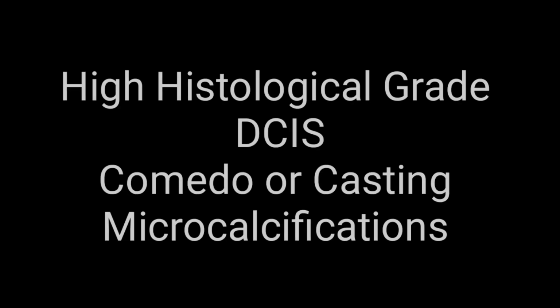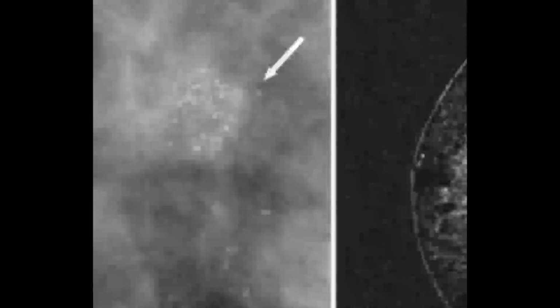The first important type is high histological grade ductal carcinoma in situ. It is called casting, or comedo microcalcification. Here on this mammogram image, you can appreciate casting or comedo microcalcification.